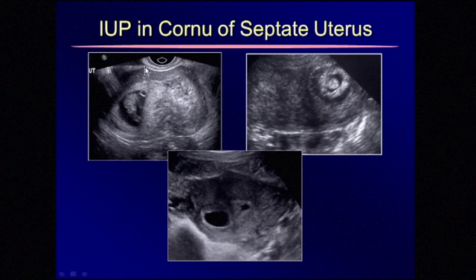Here's some samples. We have an eccentrically placed sac, but we do have a split here between the endometrial areas. Here's the endometrium on one side. There's the shadowing from the septum. Here's the pregnancy in the other horn, fully engulfed by endometrium. Here's another one. There's a separation, and we have fluid, these two fluid areas. One is the sac, one is possibly bleeding, or another twin degenerating.